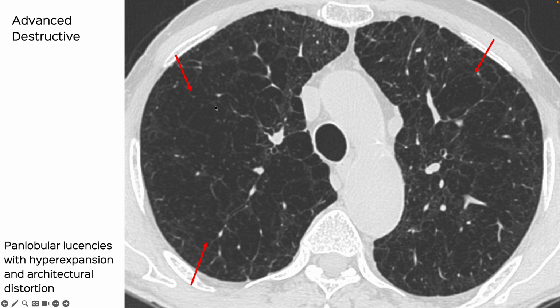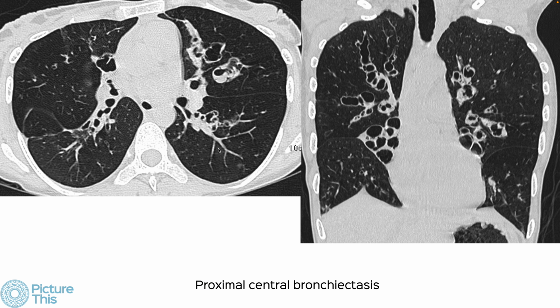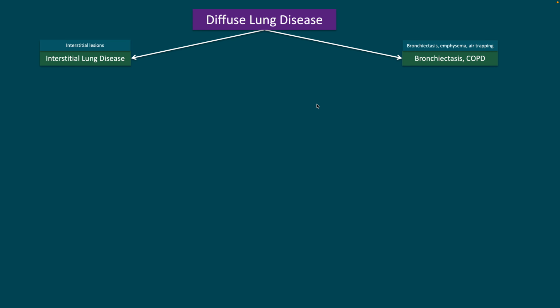So emphysema, and this is advanced destructive, will have lucencies, cysts without walls, confluent, overinflation, etc. And bronchiectasis would have branching tubular, saccular lucencies going from the hilum to the periphery. And if you have a whole set that you can scroll through, this is one of the easiest diagnoses to make radiologically, plus clinically. The patients who have bronchiectasis have very specific symptom profiles and signs.